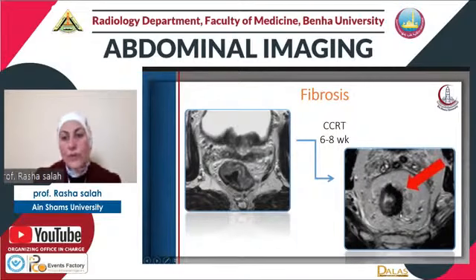We can notice over here that there is a significant low signal intensity noted at the left side of the rectum, which corresponds to the previously seen mass lesion on the initial MRI. This significant low signal denotes fibrosis, but is the T2 weighted image enough to call that this is a fibrosis with complete radiological response?